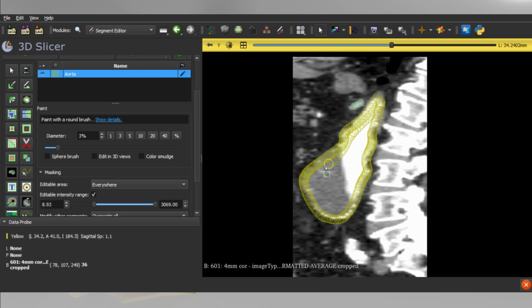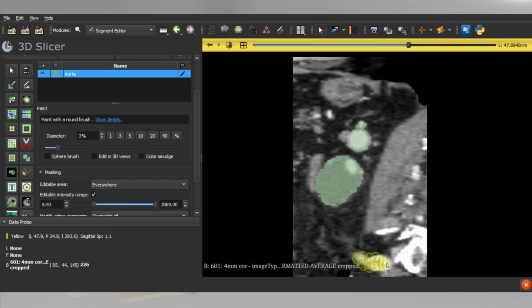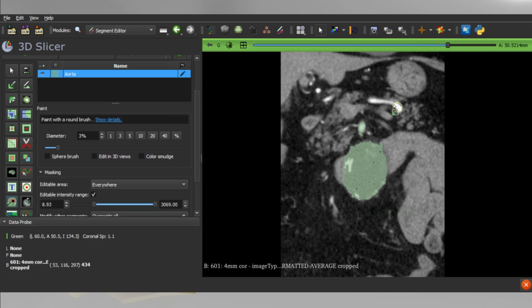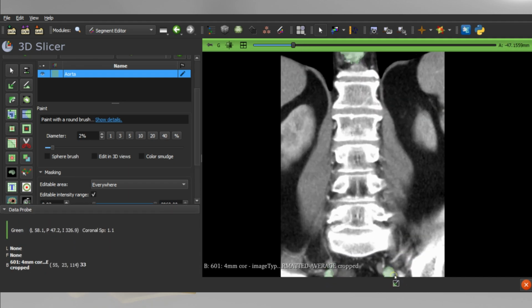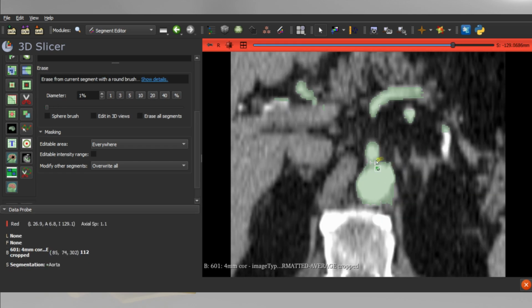There is a great risk of detecting areas that do not belong to the aneurysm. For this reason, we marked the structures layer by layer manually. Even though the segmentation takes longer this way than using an AI-based tool, the result is more accurate and reliable. This also minimizes the time needed for post-processing and adjustments.